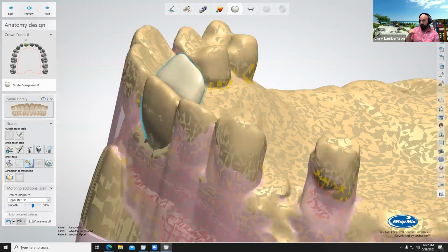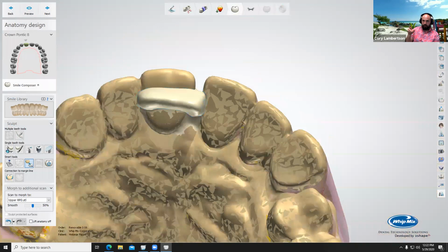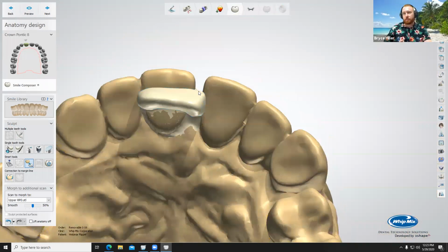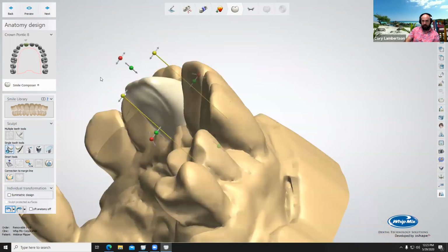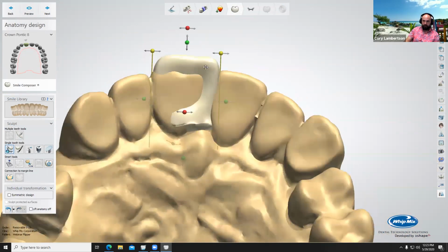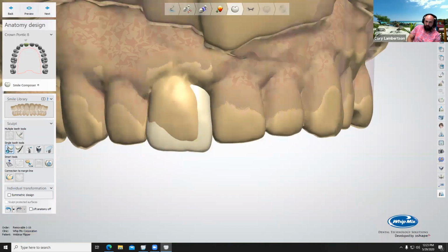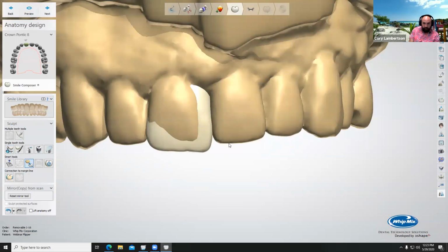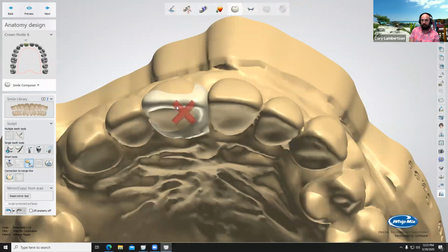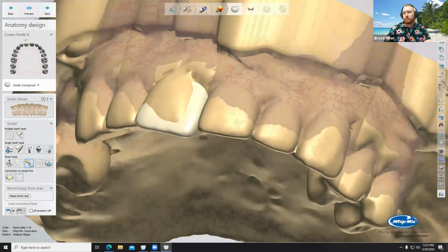No. What I was saying is go ahead and use your morph to just recreate that. Well, hang on a second. Oh, I can't. Go ahead and undo, and then change it back to copy, not additional scan, but your other option. Go down to the drop down again. All right, so mirror copy from scan. Do that process again, and then you'll have to pull that other scan back on. I see what you're saying.